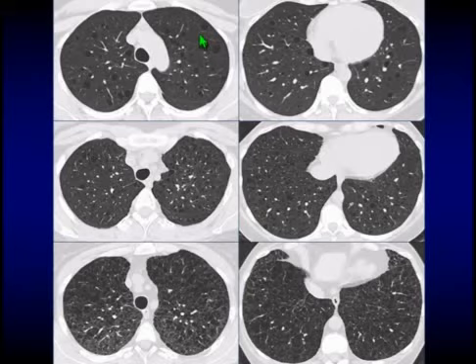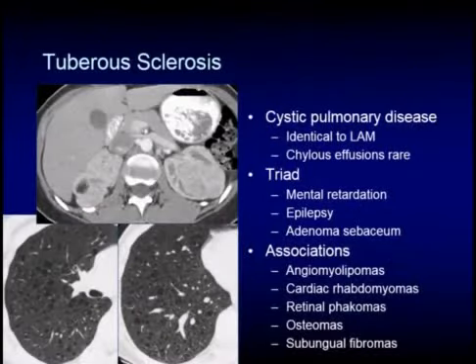And here we see a number of different patients with LAM of varying severity. Look at that: the core structure looks like it's embedded in the wall. You don't see any of these cysts with something going through the center of them, and they all have a thin perceptible wall, normal intervening lung, and no real zonal predilection, but are fairly diffuse. And these are cases of LAM.